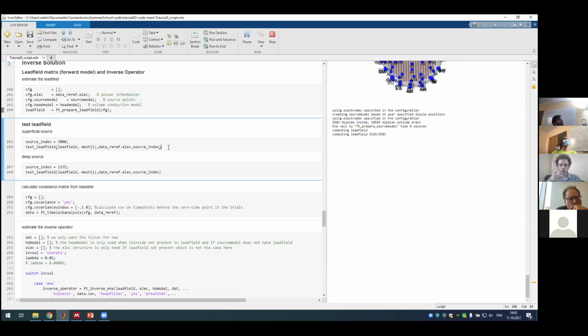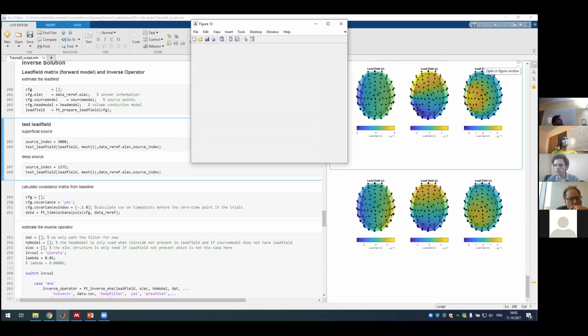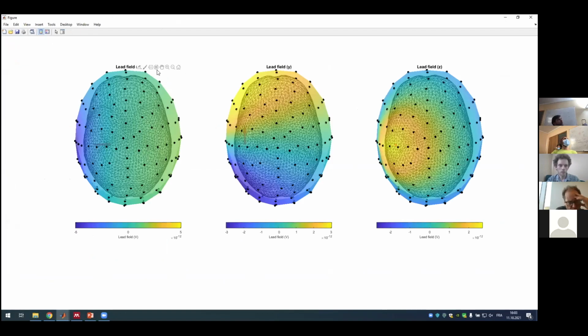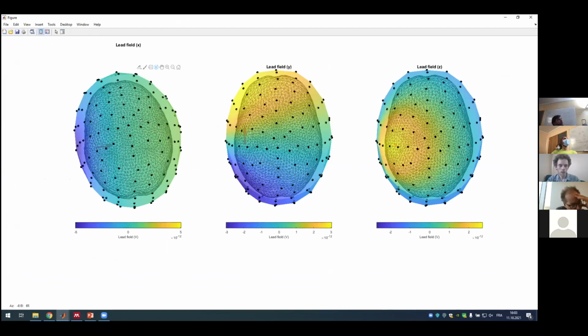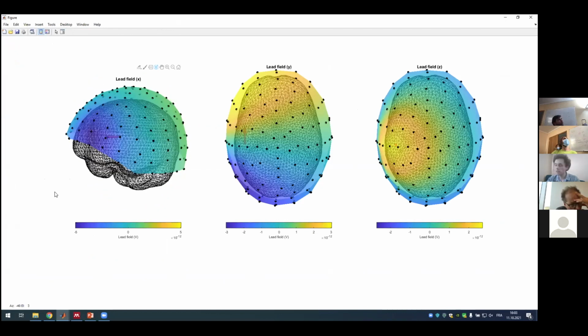And again, here we have, for each source, 3 orientations of a small dipole. So here it's what I will show you right now. Using this representation, you see that you have the maps. I hope you see, down there, there is the source.